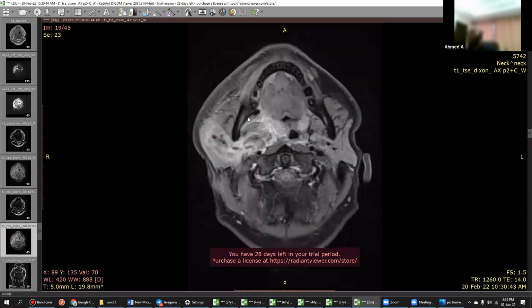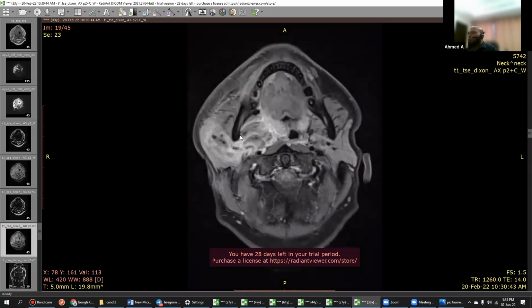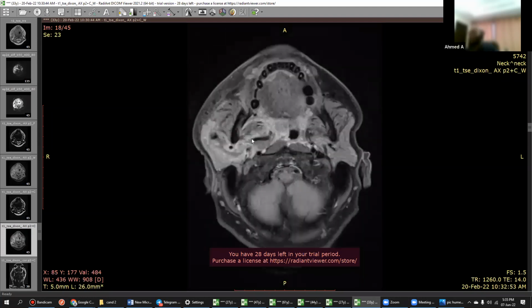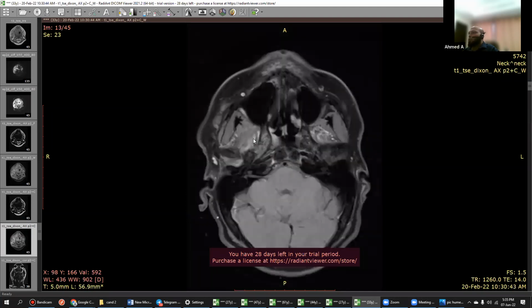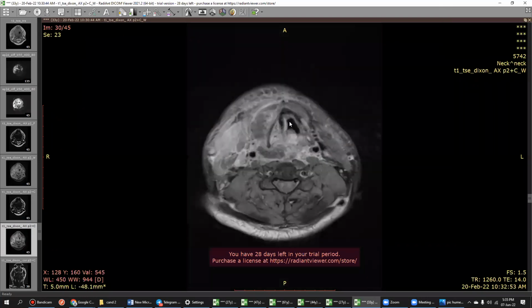Usually in the real scenario they will tell you the history of dental extraction, but in this case it was very nice. The second most common cause, what I have read, is the parotid and the calculi causing sialolithiasis, which has caused so much infection. Good case.